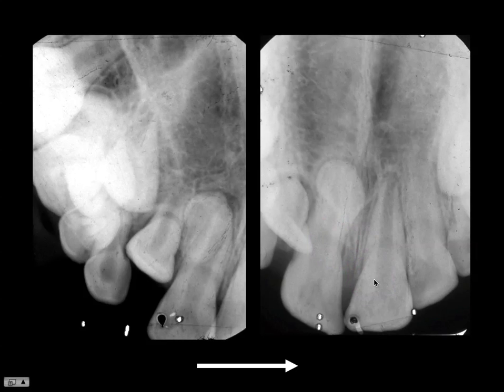Now, have a think for a moment and tell us, where is that supernumerary position? Is it lingual or palatal to the root of the incisor, or is it buccally placed? Well, as our perspective has moved in the direction shown by the arrow, you will see that the supernumerary tooth has moved in the same direction relative to the root of the central incisor. So that means it must be lingually placed or palatally placed in the upper jaw.